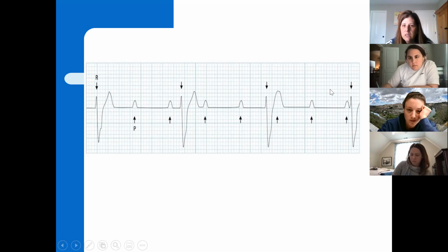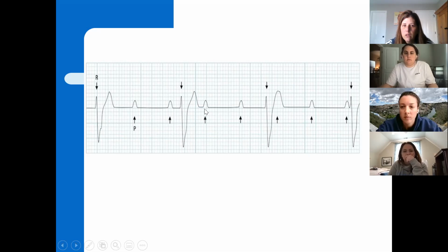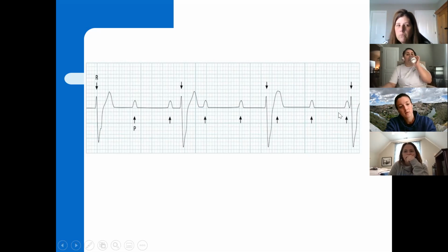Here I have 2 P's and no QRS, but you see it doesn't go longer, longer, longer, drop, because here it's longer, here it dropped something. Here it's long. They're saying there's a P in here, there's no QRS, there's another P, there's no QRS. Here's a P, QRS, and if we counted that out, it's probably going to be pretty close to normal.